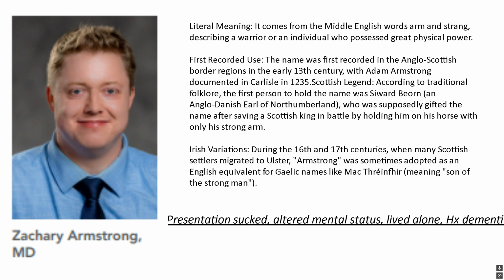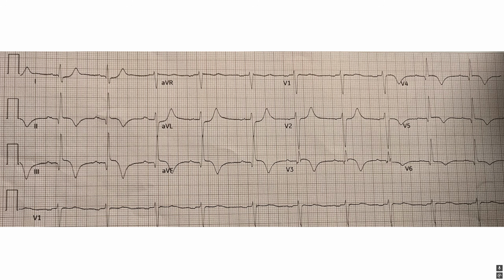Oh, yeah. And the history says presentation sucked. Altered mental status. Lives alone. History of dementia. All right. So let's go through this EKG. So first off, again, he's sending me this so we know our scale is right.